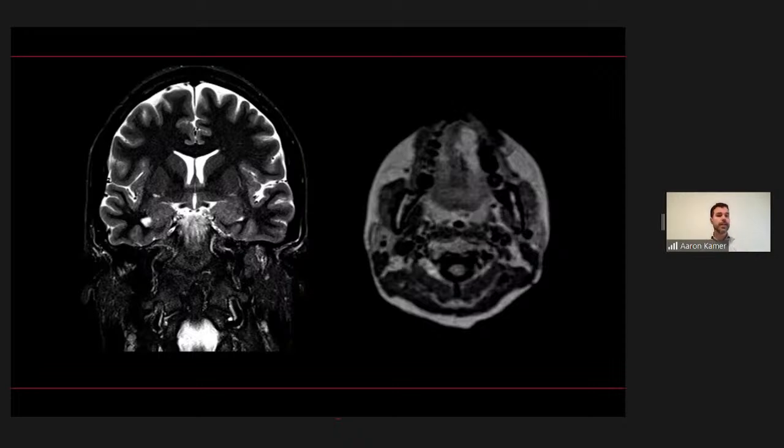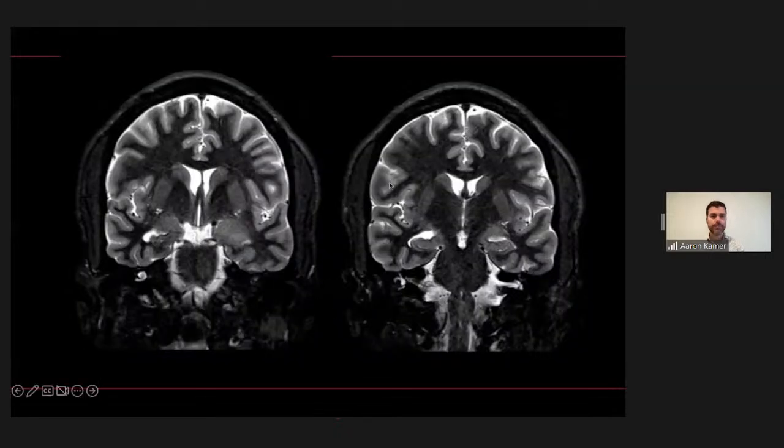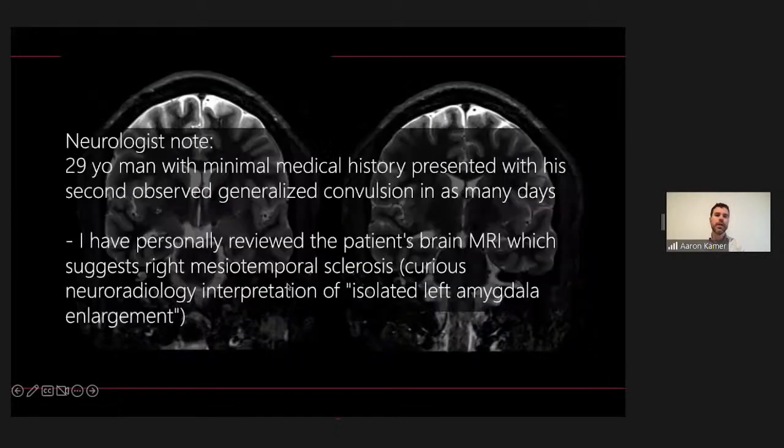This is a very real entity, even though it's not super common, it's something to be aware of. And there are some definite, very good articles talking about this as a real cause for seizure. So just be aware that isolated amygdala enlargement, not super common at all, but something to be thinking about in the back of your mind. Nice, thank you.